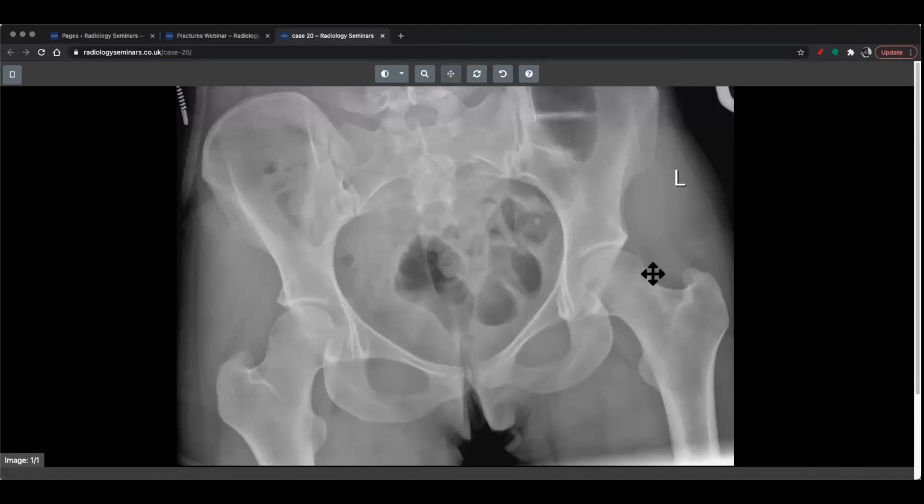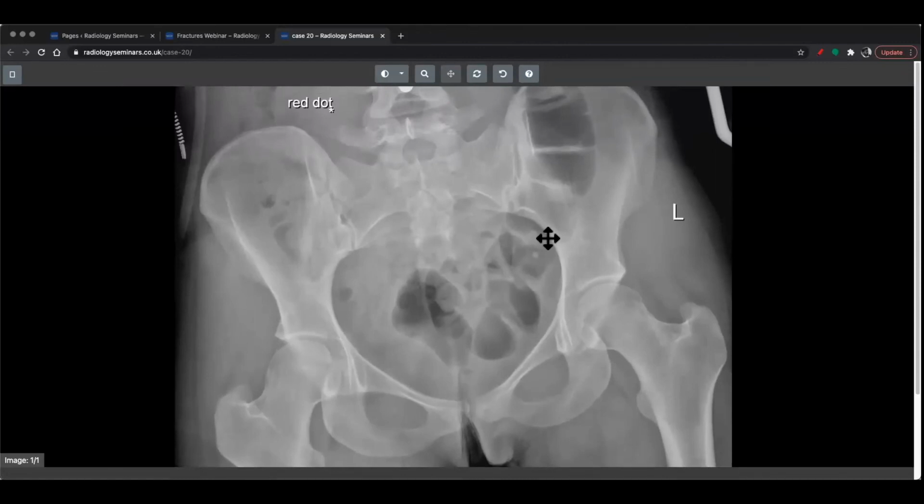You won't be getting that situation here because when it's fused, you can't slip anything. It's not possible with this patient here. But on the actual course, I'll be going through that more closely. You won't see that here, but you'll be looking for a malalignment, a quite distinct malalignment. Good. So those are all the cases that I have.